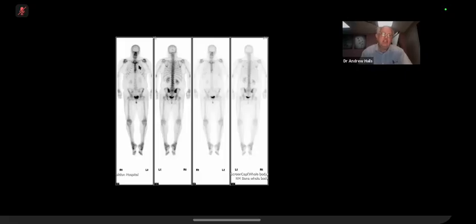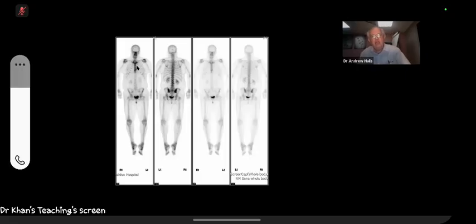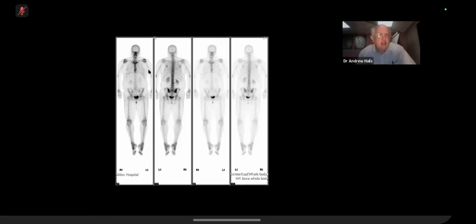You've got degenerative change at the sternoclavicular joints and at the shoulders. They're so common on a bone scan, really they're normal. You can also get some hot spots at the patella, which this patient doesn't have, which is also normal. Now, down in the feet, this probably does represent an arthropathy, but you find it very difficult to find, other than in a really young person, a bone scan where there wasn't some degree of arthropathy. So this is basically a normal whole body bone scan.